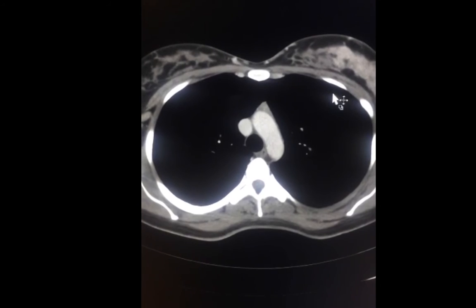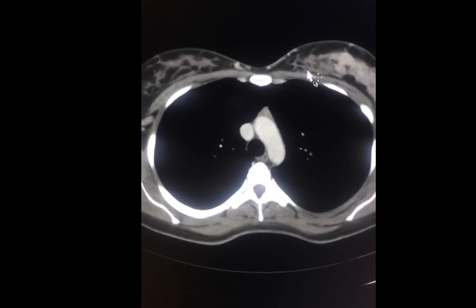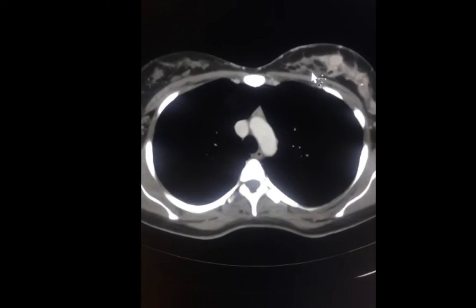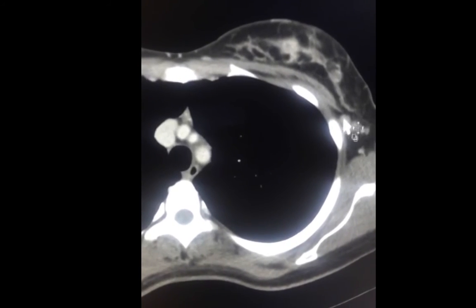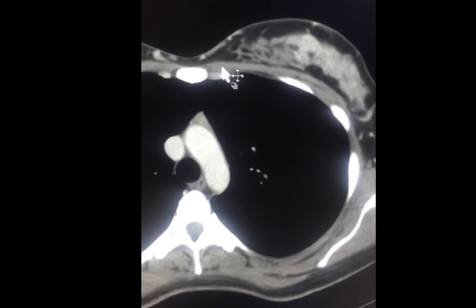We learned from this case to look at the soft tissues, the breasts in particular. We also learned that CT is not the best way to go with breast lesions. However, you may see important abnormalities. When looking at cases of malignancy, don't only look at the axillary lymph nodes, make sure you don't have other lymph nodes such as the internal mammary ones.